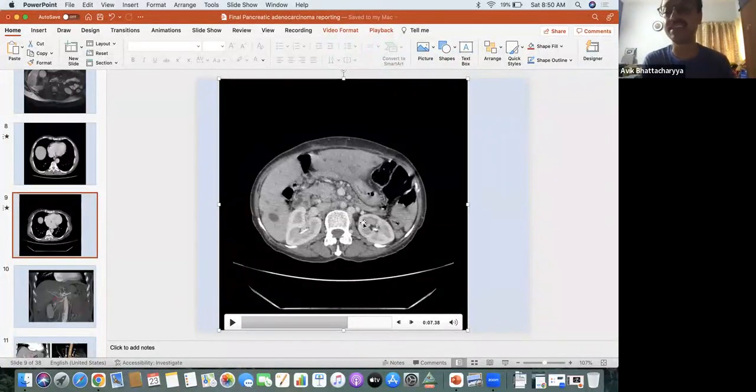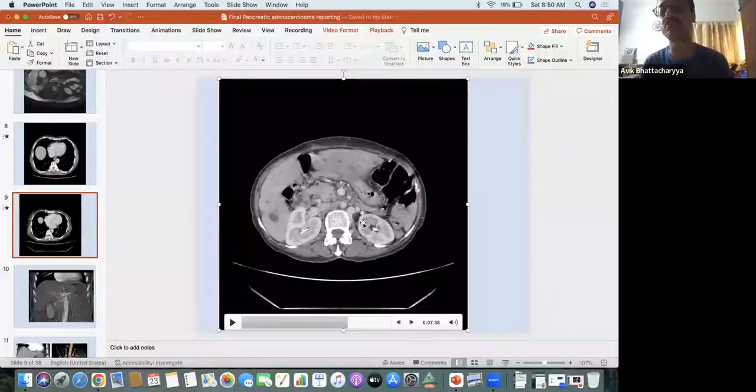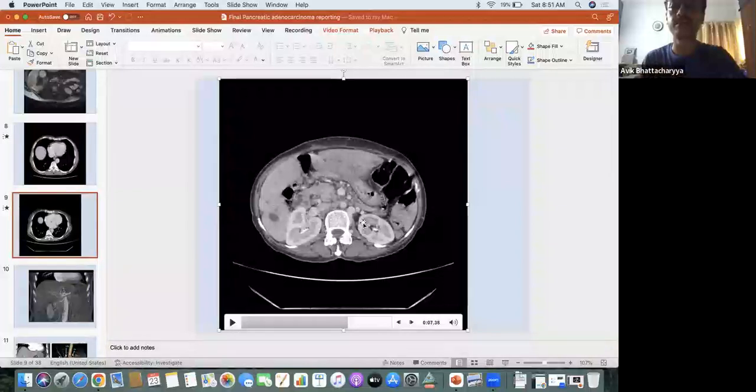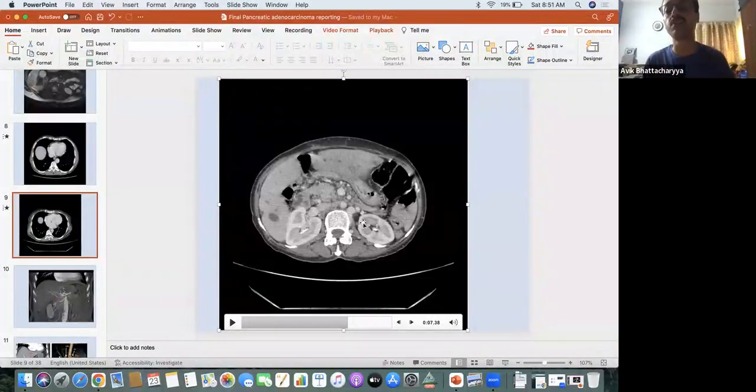It is really fascinating to see the lymph nodal groups, the mass, its infiltration, whether the celiac trunk is infiltrated. Another more important thing is the soft tissue sheath along the celiac trunk and superior mesenteric artery. Sometimes, a bit far away from the tumor, you will have a sheath, soft tissue structures like cuffing alongside the course of the superior mesenteric artery or celiac trunk.